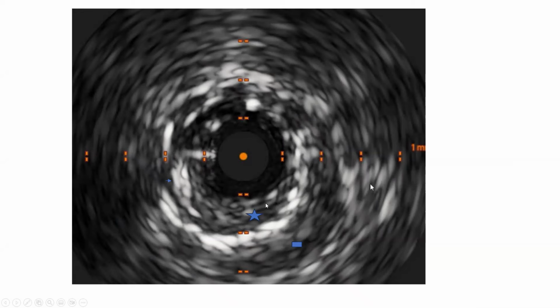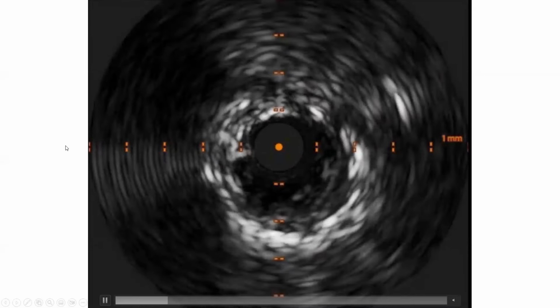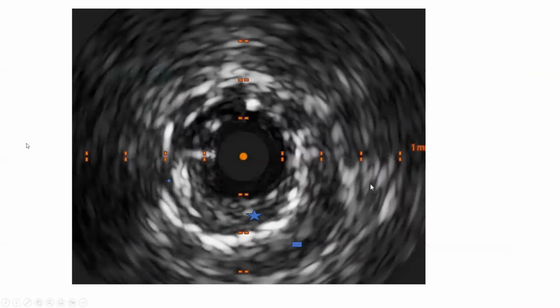This is an area where you also clearly see the two stents. You see the old atheroma, the original native atheroma behind the stents, I indicated by the rectangle here. You see the neoatheroma inside the stents, marked by the star, and inside that neoatheroma, you see a piece of calcium. So basically what we have here, we have a heavily calcified diagonal stenosis, and we have a heavily calcified neoatherosclerosis of the LAD.